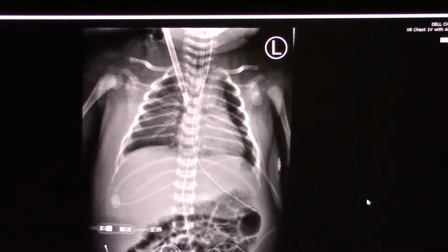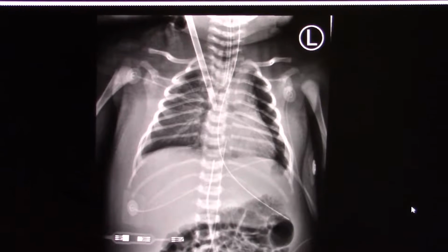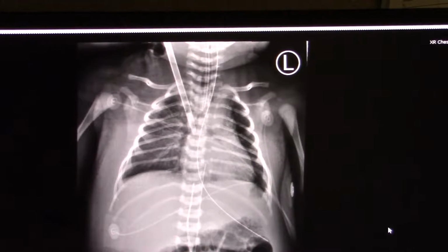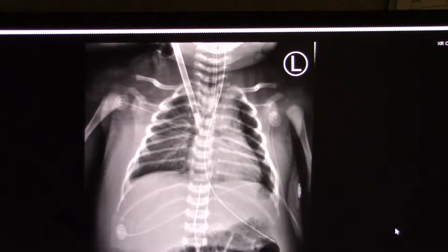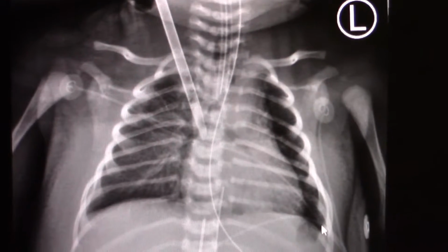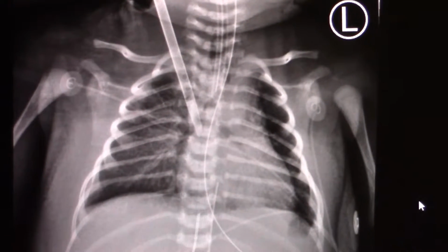Okay, today we're going to talk about our new practice to document where the tube is on the x-ray. We're going to do this at the beginning of every shift and after every x-ray that's taken on your shift. So when you bring up the x-ray on PACS, if you don't know how to do that, get with a charge or somebody to show you.